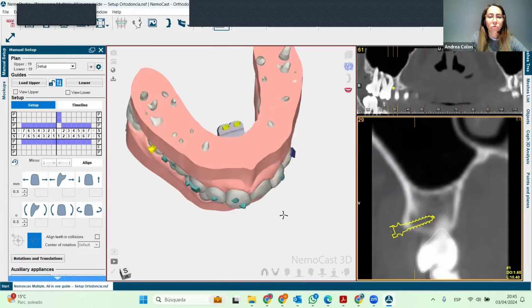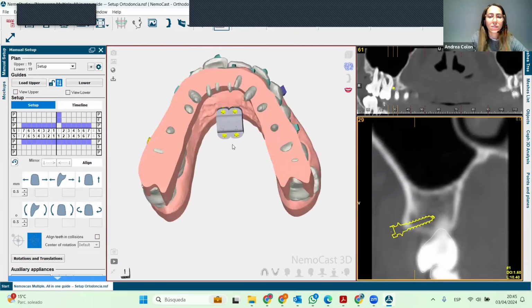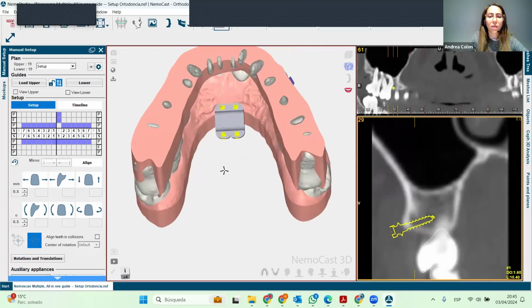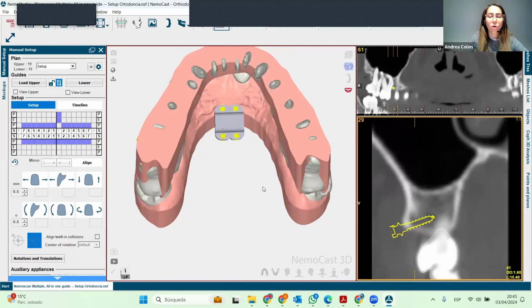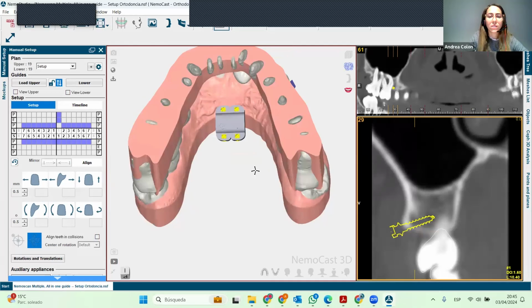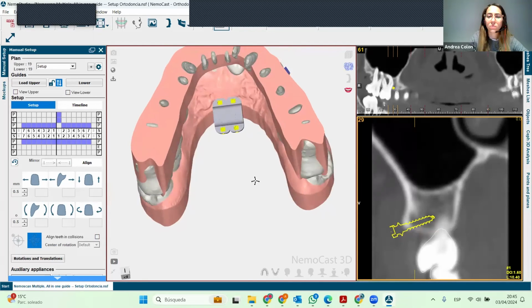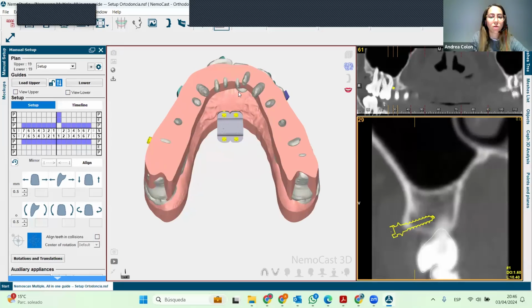These micro screws also come from different libraries, the same as for the marpe piece design. This model is a little bit short, it's cut here, but this is more or less how you can plan a marpe piece design. Then you can print it together, the shape of the marpe piece, to get it directly and do the other manual processes in the lab with the marpe treatment.